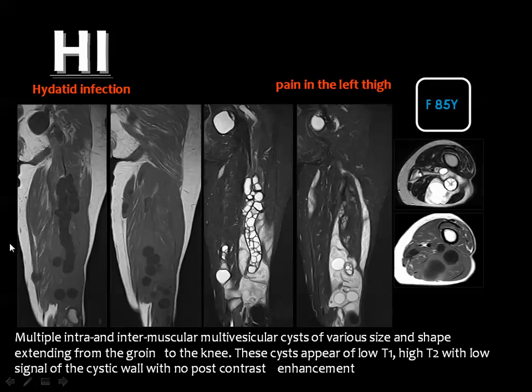And this is hydatid disease of the thigh of a female patient 85 years old, showing the classic appearance of an extensive hydatid disease of the thigh.